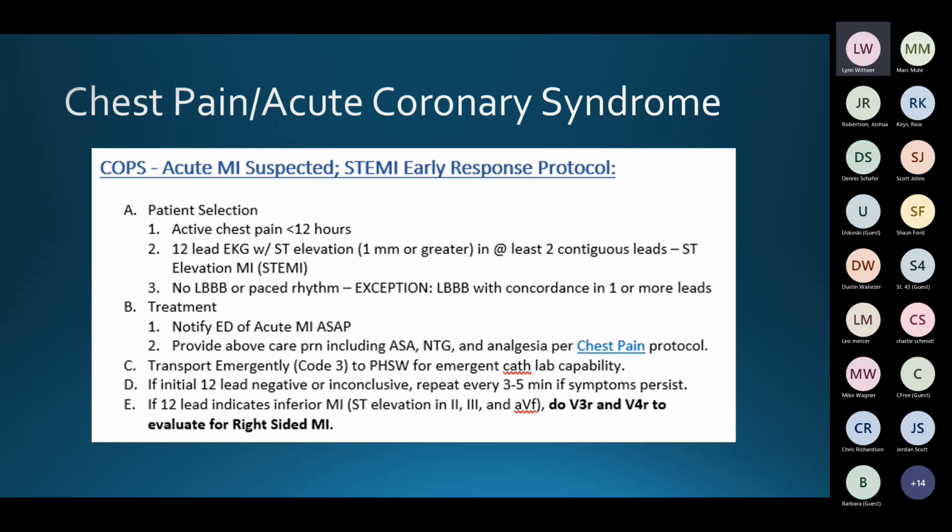There are a few other ways to sort out whether you have a myocardial infarction associated with a left bundle branch block. Besides concordance, this is all part of the Sgarbossa criteria, but the biggest bang for our buck is on concordance.